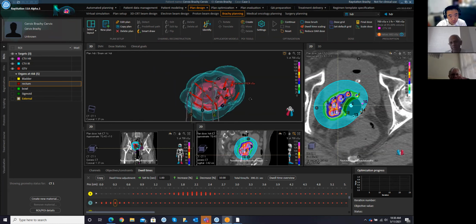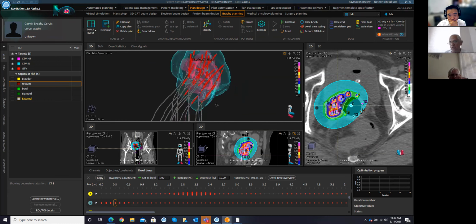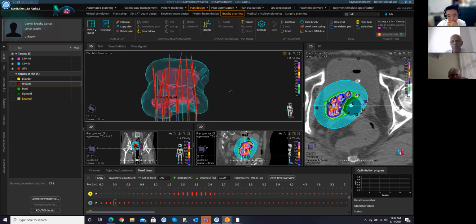It'd be nice to have only one way, where the user can basically disable the other option, so that there is no mishap and going in the opposite direction. Well, sometimes you want to go the other way. We have cases where it's a lot easier to go from a template on the perineum. Right, I very much agree with that. Yeah, I agree, it's easier to go from the tip.